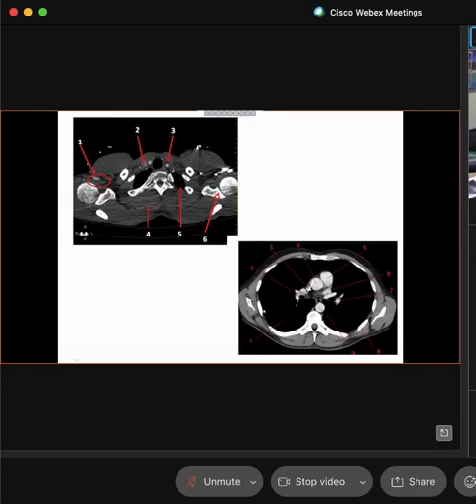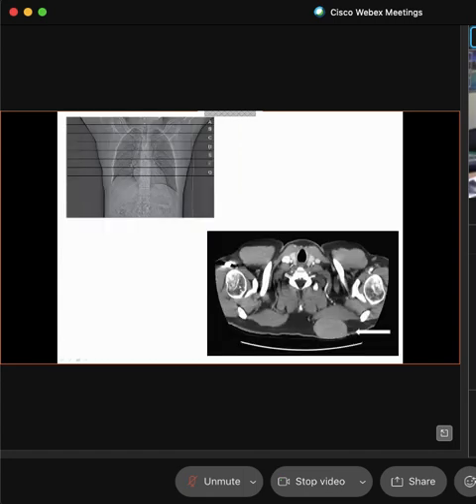Okay, so let's take a look at these two. Now here we saw humerus or bone. What would be round, right? Here's your vertebrae. Always look for your vertebrae. Look for your vertebrae when you're in an axial projection. See what's around the vertebrae. See what's going on to the sides, laterally. What is happening anteriorly? Okay, so this is the way that you'll start to look at these images.